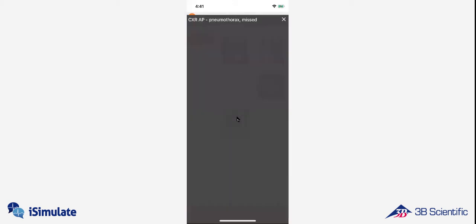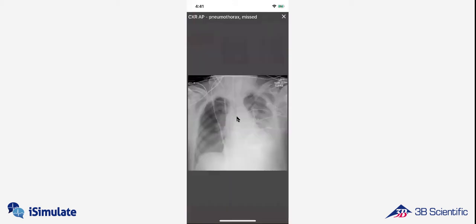So it tells you that things are active, and then you have the ability to disconnect as things occur within the scenario. So for example, they order a CAT scan and that is broadcast in the scenario, then that'll show up on your app as well. Maybe they want to do a new chest x-ray and see if there's any difference. And we'll show you a new chest x-ray on the screen here as well. As soon as the students receive the information, then it's sent across to the app here. And then you have the ability to expand it and look on your phone to have a little better view.